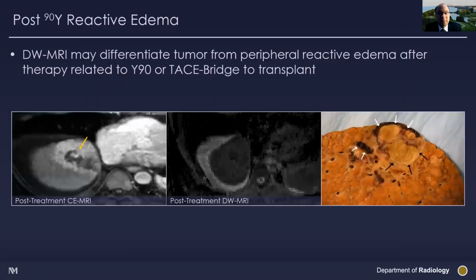Sometimes it's difficult, as I mentioned, you can get these peripheral reactive edema after the therapy. Notice here, you can see all this enhancement and this reactive enhancement, but notice it was helpful. Again, the diffusion, not showing any restricted diffusion. Before it was restricting, and at the time of explant, the tumor was completely dead.